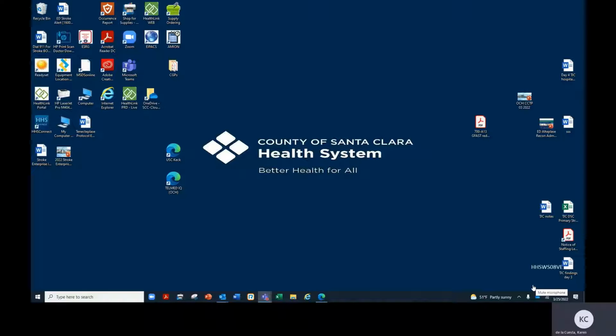Welcome to the module on how to activate the on-call teleneurologist at O'Connor Hospital. Once you're requested to activate the on-call teleneurologist for either a code stroke alert in the emergency department or the inpatient setting, simply find a local computer, check out the desktop, and look for an icon that either says Telemed IQ O'Connor Hospital or USC Keck Teleneurology. What you'll do is left click twice on that icon.